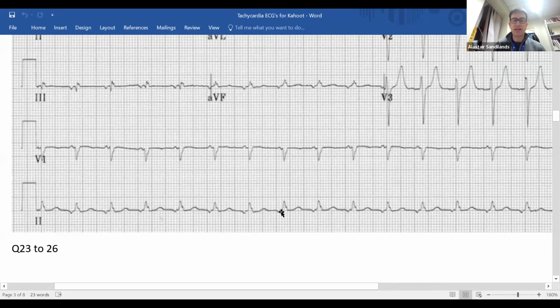Do we have any P waves? Yes. Look at the P wave, it's very discrete. It's not fluttering along there. It's very discrete and focal. So this is firing off. And in lead 2, we see the P wave is negative. So that's not sinus tachycardia. Okay, that's an ectopic atrial tachycardia.